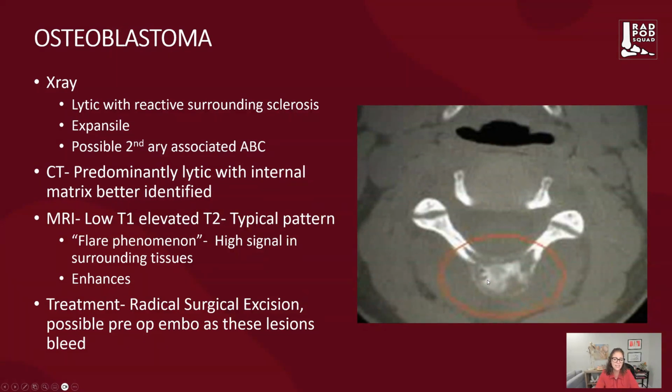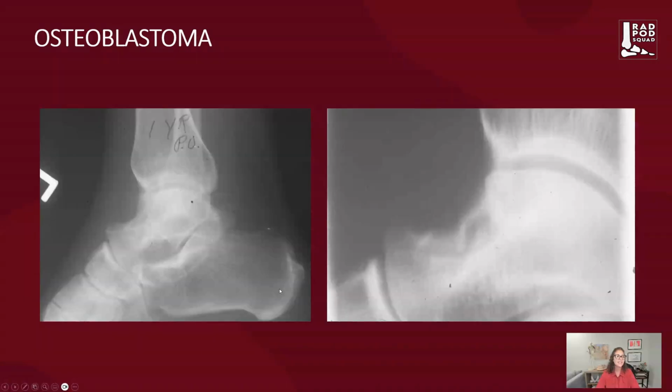These lesions tend to continue growing and they can encroach on the central canal if it's in the spinous processes or along the posterior elements. In the talus, I found a lesion. We have an osteoblastoma here.